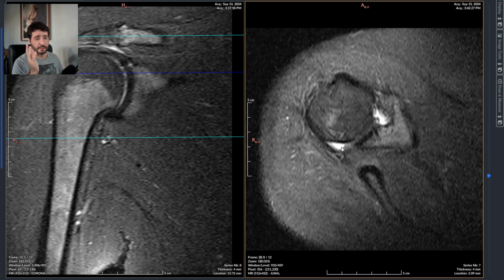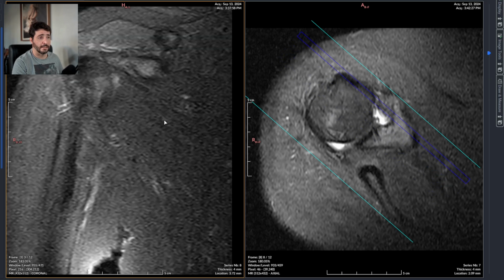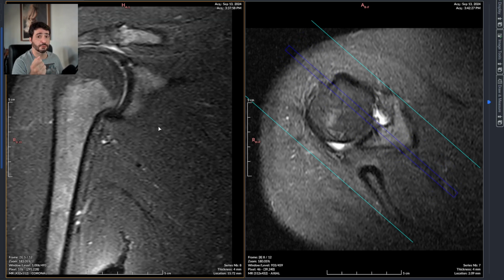In this case, this is an old machine, the patient is in a lot of pain, it's all shaky. This exam was made with a very large field of view, which reduces the overall resolution of the images, and it's really difficult to be sure about a fibrocartilaginous tear in this case.